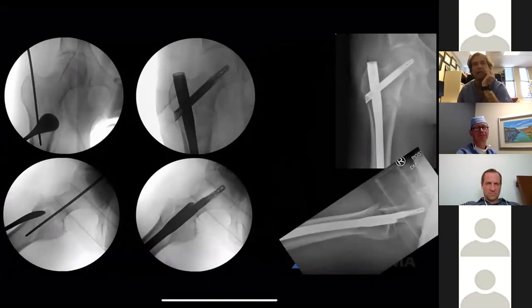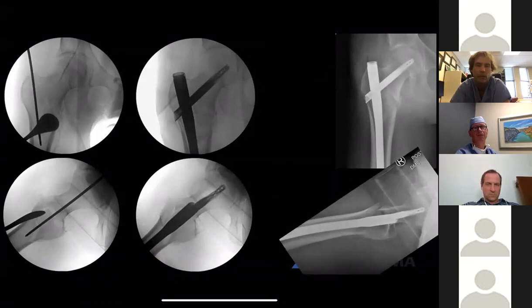So here's a lateral x-ray. In that scenario, I felt like things weren't reducing through closed manner, and I felt as though I needed to help. So I made an incision as you described and put a cob over the top in order to try to posteriorly translate the distal segment. If you have a gap anteriorly that you see on the under-rotated view, then either lifting the foot in order to change the sagittal plane alignment or internally rotating the foot will close down that anterior gap, according to the study that the AO did. And I think that's interesting, and sometimes it works, not always.